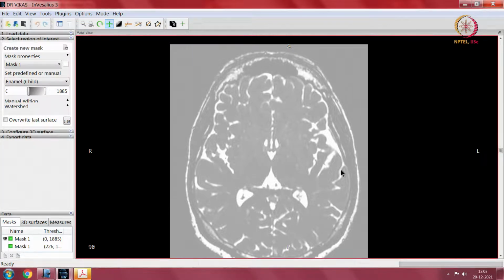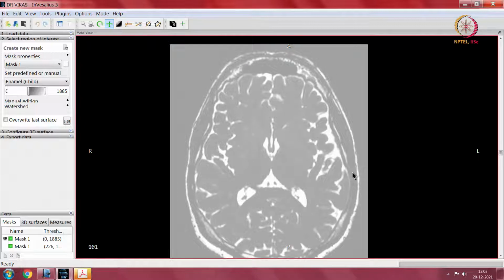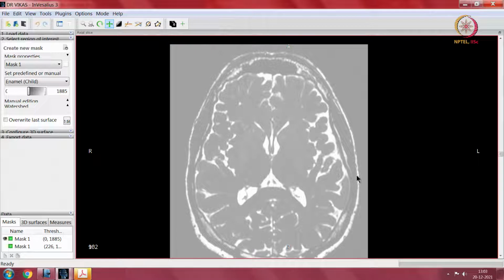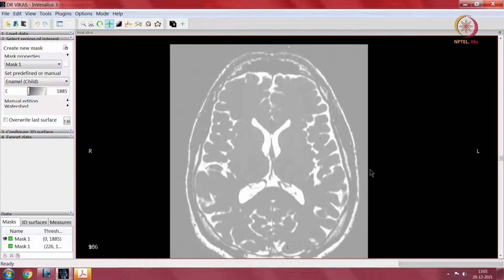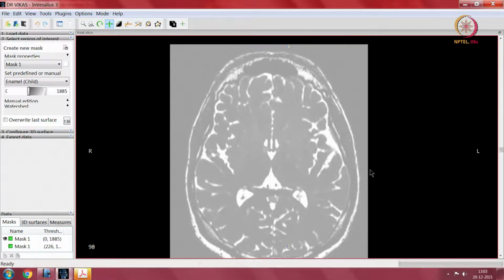It is difficult. See, this is not a textbook from which I am drawing up an image. This is from an actual person, and you should know that this is the difficulty in understanding brain anatomy and comprehending stuff which happens within the imaging space.